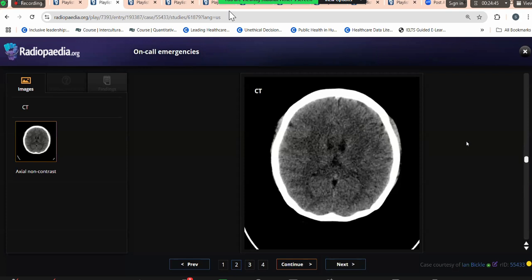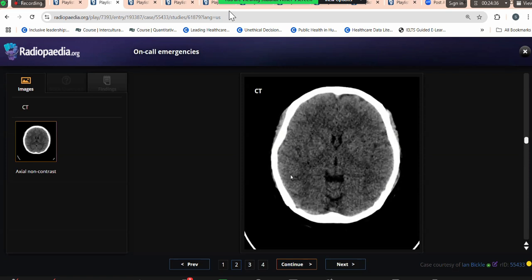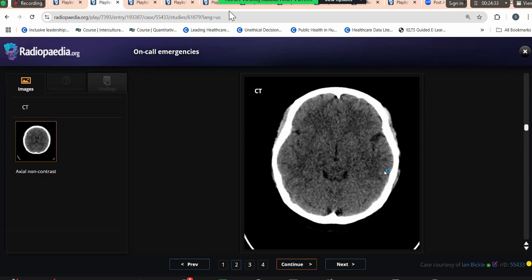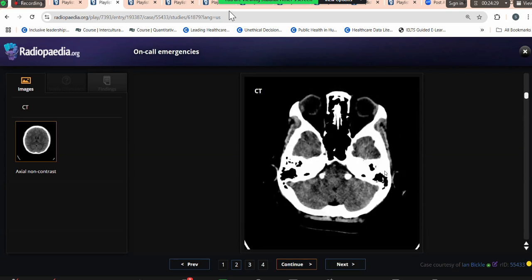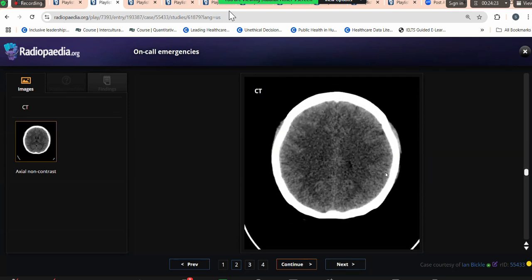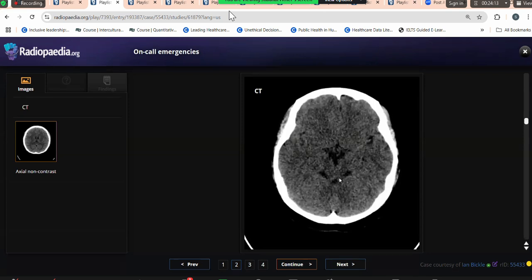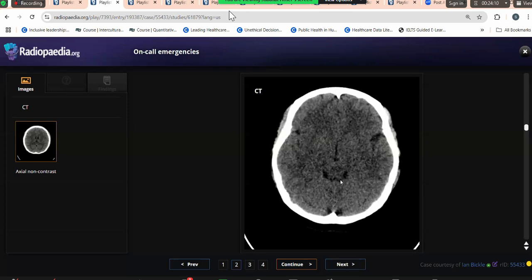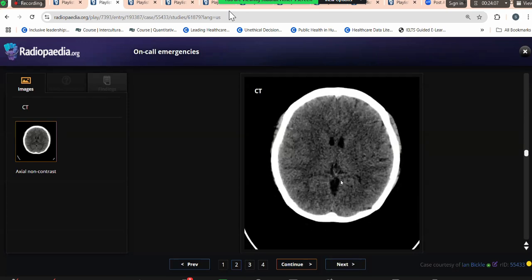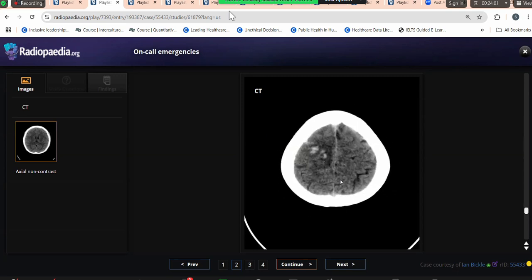When you are describing the findings, it is always a good way to put your cursor and point out the findings which you are describing, yes? It becomes easier for the examiner to assess. So I can also appreciate that there's some sulcal effacement. Which side are you talking about, Candidate 4? On the right, along the right parietal. There is generalized, but along the right parietal I can appreciate it most. Okay. And since I saw an intraparenchymal hyperdensity likely in keeping with a bleed, I'm looking for any other subarachnoid hemorrhages or any other segments. But I do not appreciate any.